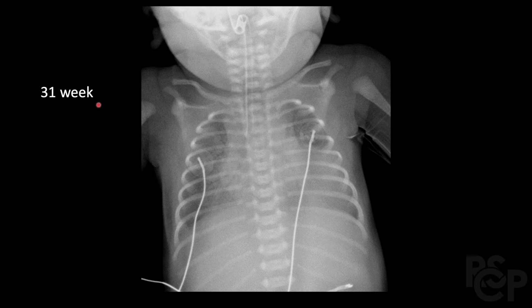This patient is 31 weeks old, so they're premature, and we can refer back to the chart on the first slide that helps us guide clinical findings with the radiological findings. So this patient is 31 weeks old, presenting for respiratory distress, and we know that they're premature. And then we start off by looking at the lung volumes. We identify that the lung volumes tend to be a little bit smaller over here, as we can see. And the lungs are quite hazy. We notice these diffuse opacities present bilaterally. It's pretty hazy throughout on both sides.